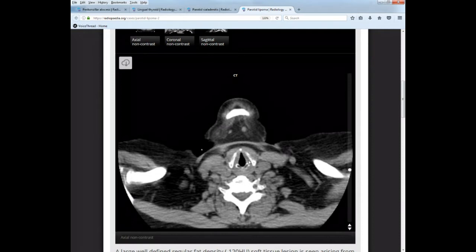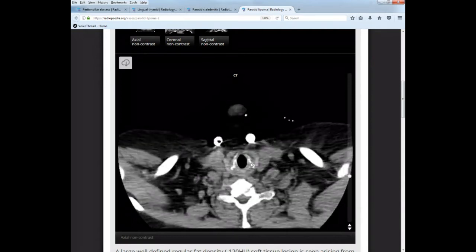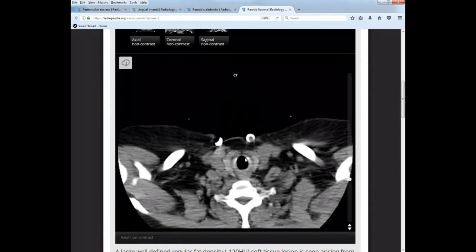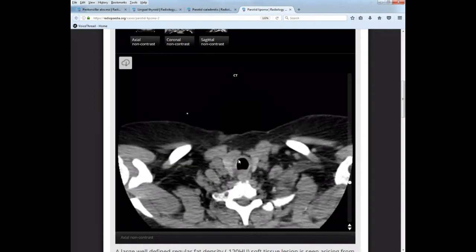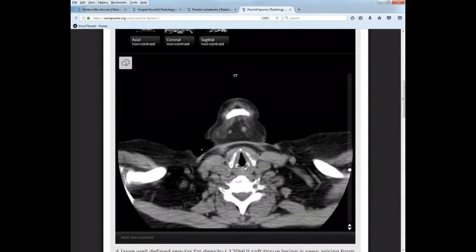But the one cartilage that does form a complete circle around here is the cricoid, which is just inferior to the thyroid cartilage. So if I go down, I can see this one here that's coming around, still coming around, and then it's really cartilaginous. It's not as thick there. I'm not quite seeing it. So that's your cricoid cartilage, okay?